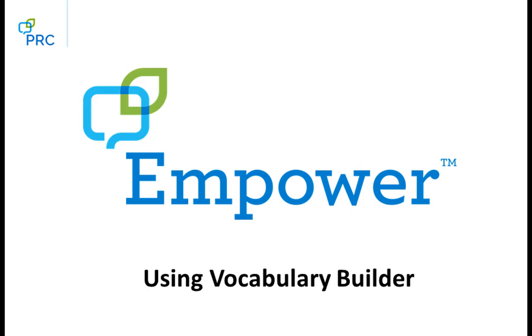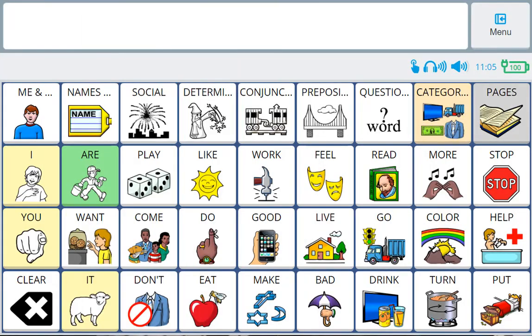I want to show you how to use Vocabulary Builder in Empower to temporarily limit the words showing on the screen. You may want to do this to reduce distractions for individuals or to emphasize certain words you want to teach. I am currently in Unity 36 sequenced, but know that the way you use Vocabulary Builder in the other Unity configurations and LAMP Words for Life is the same in Empower on an Accent speech generating device.